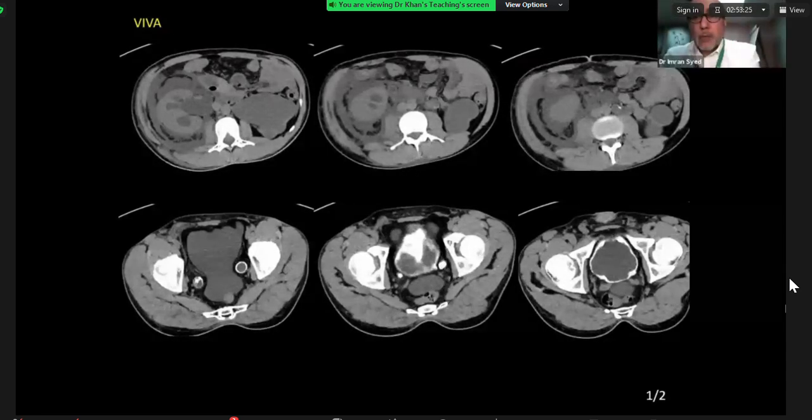Okay, good. Right, so as you've described, there is calyceal dilatation of the right kidney, which is moderate to significant. There is partial clubbing of the calyces, which is important. The important negative pertinent point, if you'd like, is that there is no cortical thinning. In other words, there is preservation of the renal cortex. There is significant perinephric stranding. There is fluid seen tracking into the perirenal space, thickening of the fascia of Zuckerkandl.